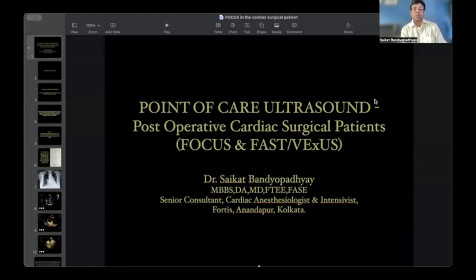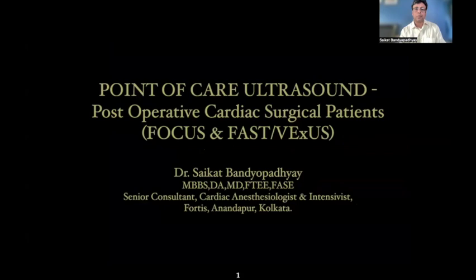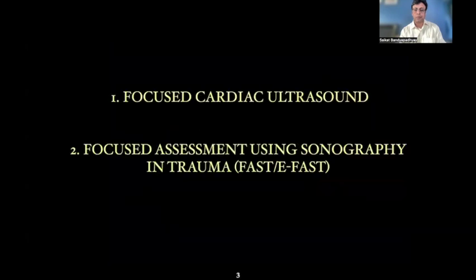Today, I'm going to talk about point of care ultrasound in the post-operative cardiac surgical patient. So, we are basically going to talk about focused cardiac ultrasound and all the views pertaining to it. Also, we're going to talk about EFAST. It's basically extended focused assessment with sonography in trauma.